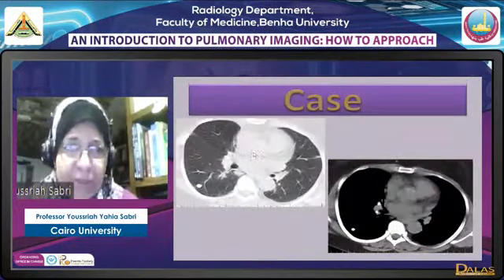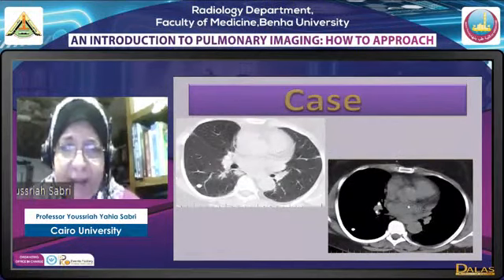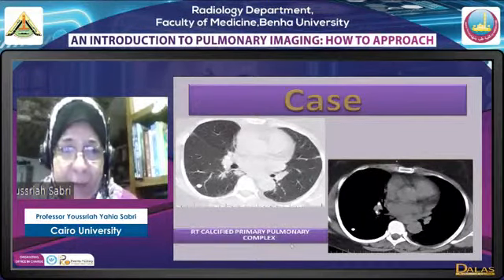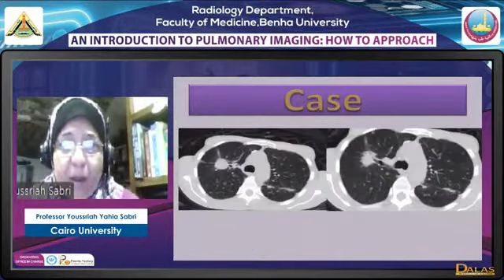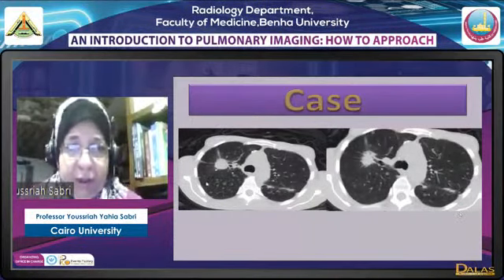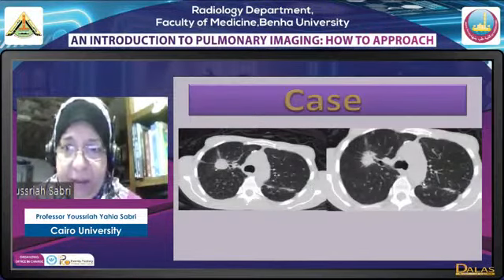In CT, another patient with calcification in the hilum and a calcified nodule in the lung, again a calcified primary complex. This patient had a scar in the right upper lobe, with decreased volume of the upper lobe. As you see, the fissure is shifted. This scar has a rather suspicious look. It was associated with nodules spread in both lung fields and thickening of the fissure.